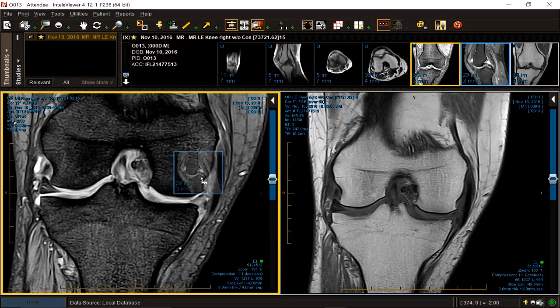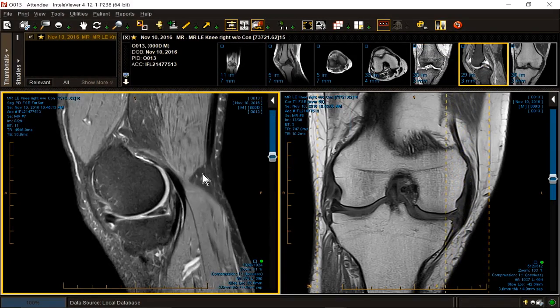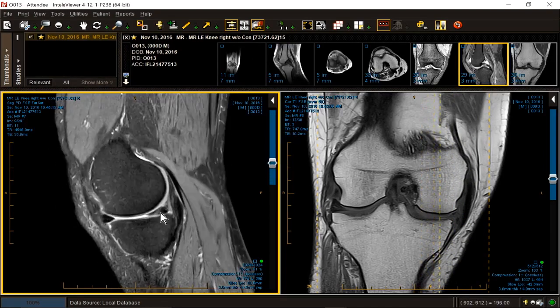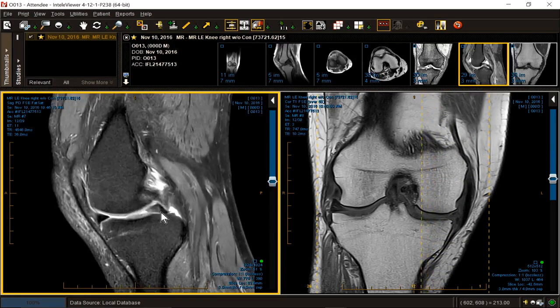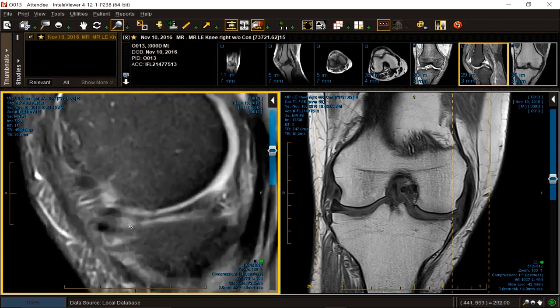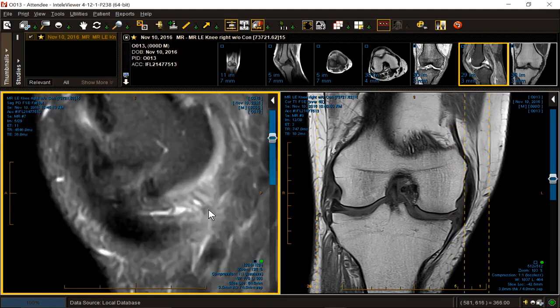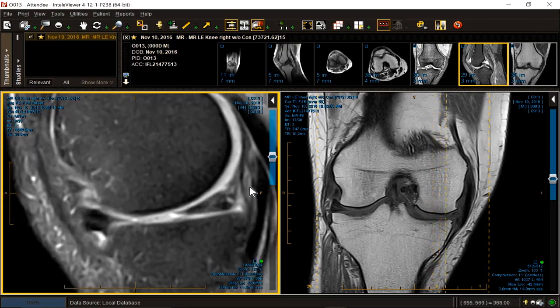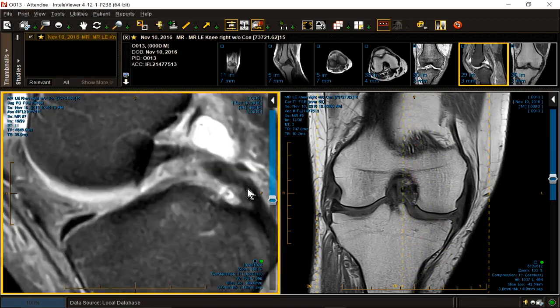Now let's see if there's anything else we could pick off in the sagittal. Well, there's our tear. It's kind of a little more ill-defined. It's much clearer in the coronal projection, especially the pattern of extrusion. There's more of the tear right there. Let's blow it up. There's more of the tear. Inner third signal intensity. Some fibrillation in the back. Let's keep looking. More of the tear. Oh, that's nasty right there. Yes, it's ill-defined, but it has no business being in the inner third. Meniscocapsular corner is swollen.